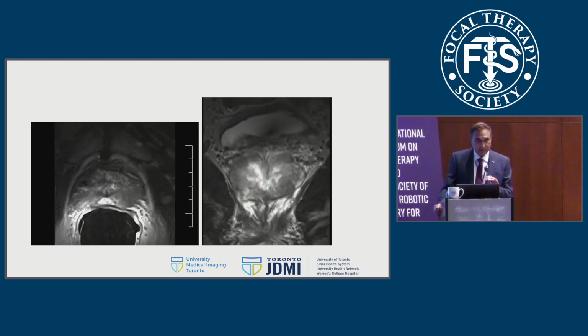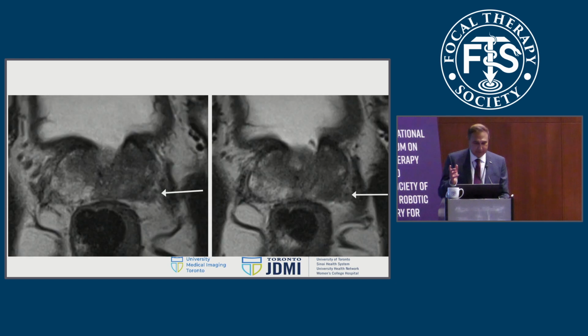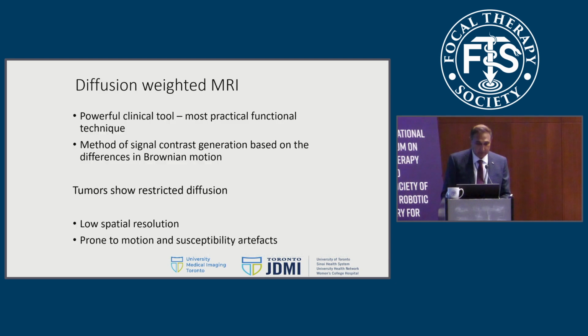And here, if you look at this image, in the left base there is a low T2 signal. And you can see those finger-like projections extending beyond the prostatic capsule with involvement of the neurovascular bundle. And this is very important information for the surgeons, that the patient is going to go to RARP. And again, on a coronal T2 weighted image, you can see the tongue of tissue projecting beyond the capsule. So this is the sequence that you're going to be using for staging. Again, an example of disease extending beyond the capsule. You can see the fuzzy margins in the left base there, and there's involvement of the left neurovascular bundle.